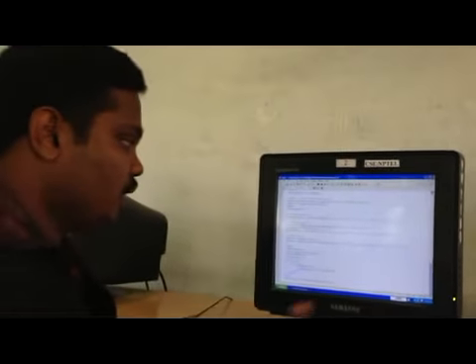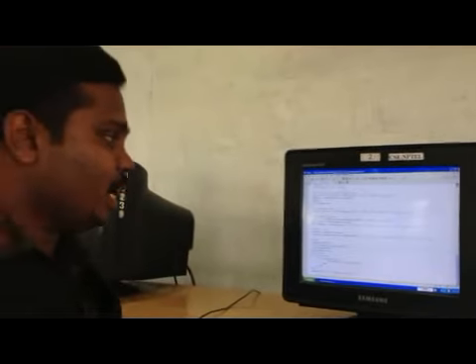Once we find the circular border, it is very easy to eliminate it, and finally we expand the areas of exudates. There may be the presence of non-exudate areas like hemorrhages and microaneurysms. We remove the non-exudate areas, and finally we calculate the area.